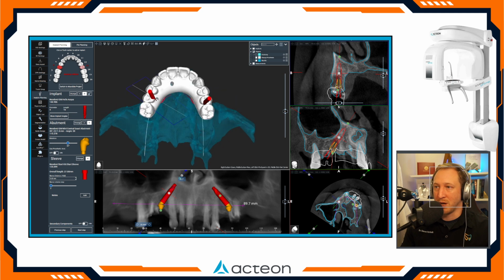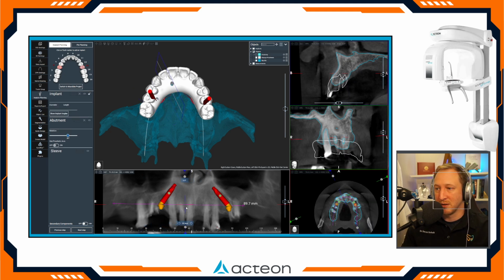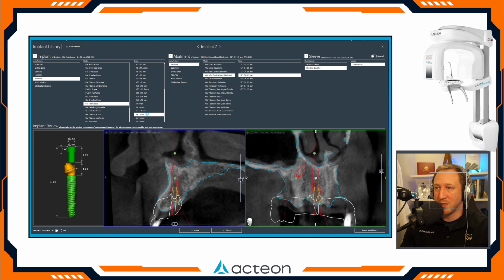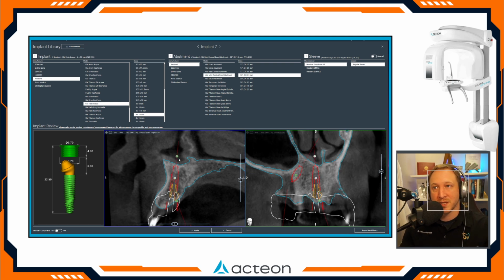Now for Don's temporary, I'm probably not going to have these molars in it. So we'll bring the molars back as we get into the prototypes and the finals, but right now the temporary will leave no cantilevers. So we got our 2 posterior ones that gives us the maximum P in our AP spread. And then generally I'm going to start by looking between the lateral and the central incisor. There's usually a nice island of bone between those 2 teeth, and that's going to be our spot for one of our anterior implants. Don't typically have to go as long. I'll usually plan an implant to be just shy of the nasal floor, and then if we're placing that implant, we notice that it's not very dense, I always have the option to just go up another couple of millimeters, perforate through the nasal floor, and get an extra little length for some additional grip.